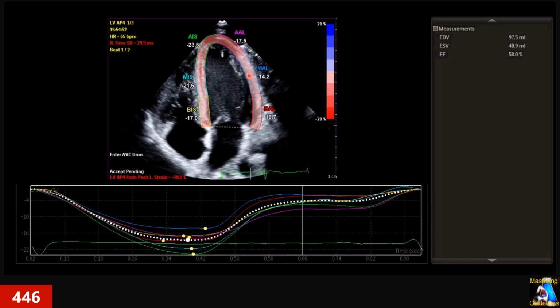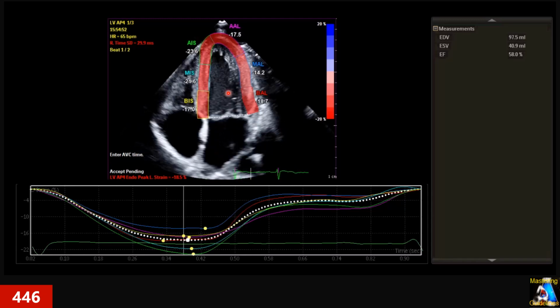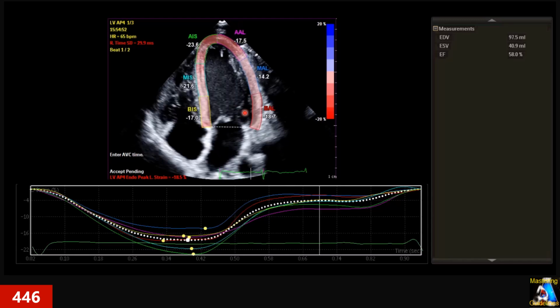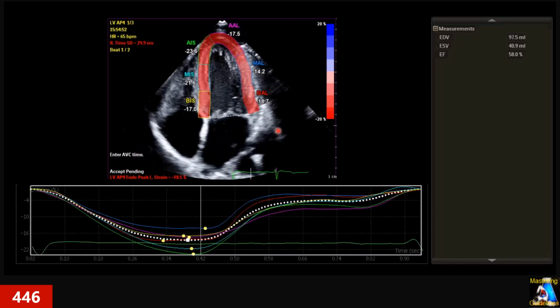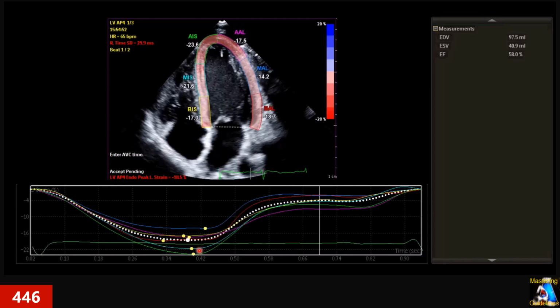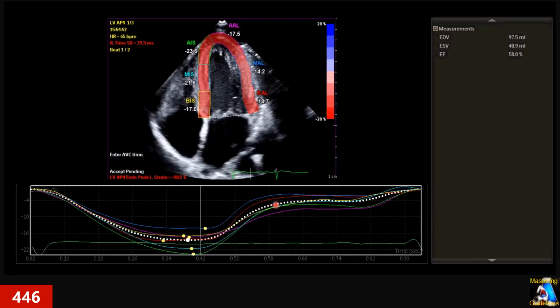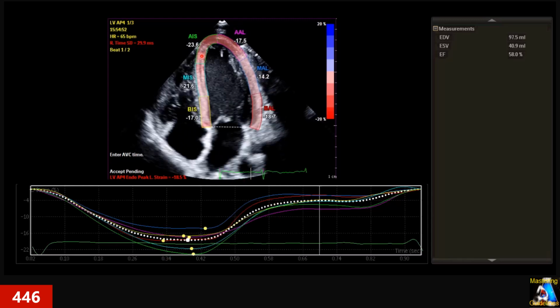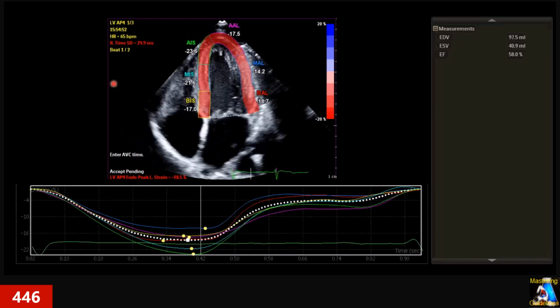How wide should our ROI be? What is your landmark and standard for correct tracing if we use whole myocardium tracing? And on the chart, do you see any abnormal finding? Does this abnormal finding correspond with the spot you are going to fix? It looks like it is a little off.